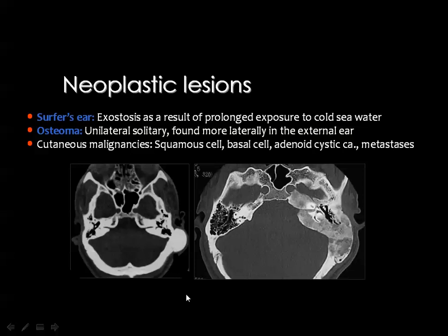And this is just an osteoma or ivory osteoma, which has been discussed in detail in the section of bone tumors. It is an osteoma with no medullary cavity that is frequently seen in the flat bones and usually encountered in the paranasal sinuses as well.